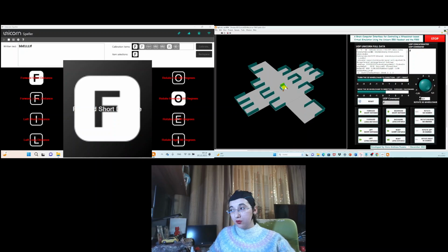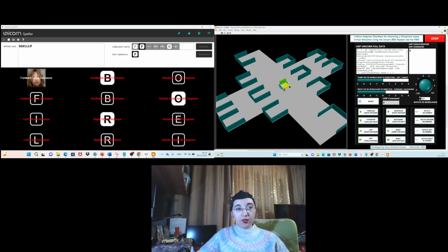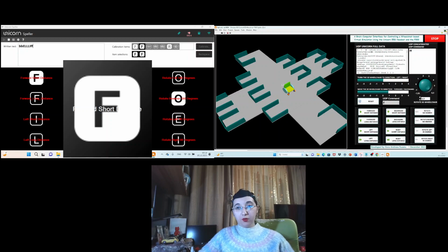Yes, it's okay. I zoomed in again. Forward short distance. Everything works perfect.